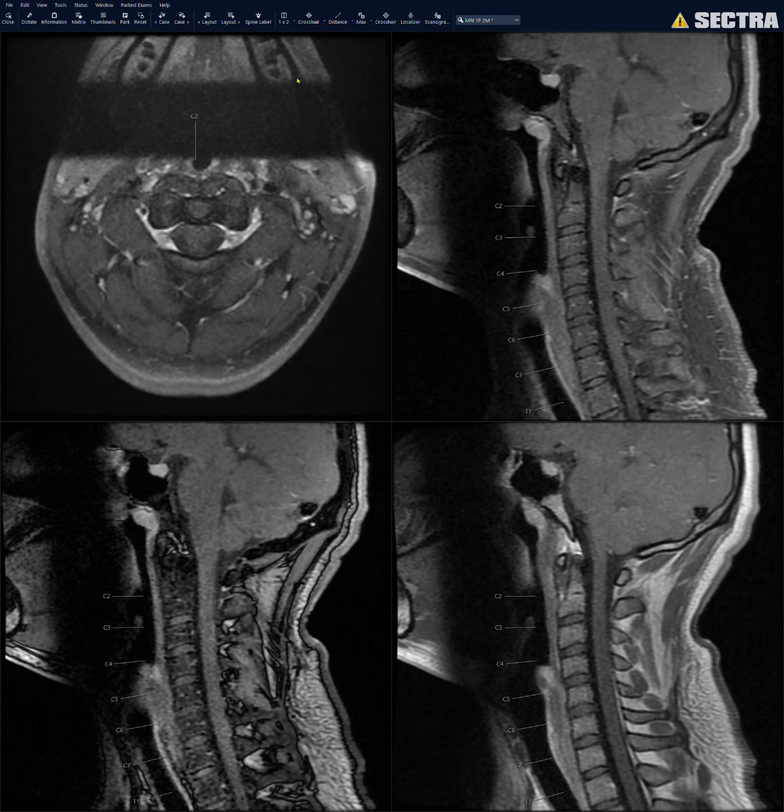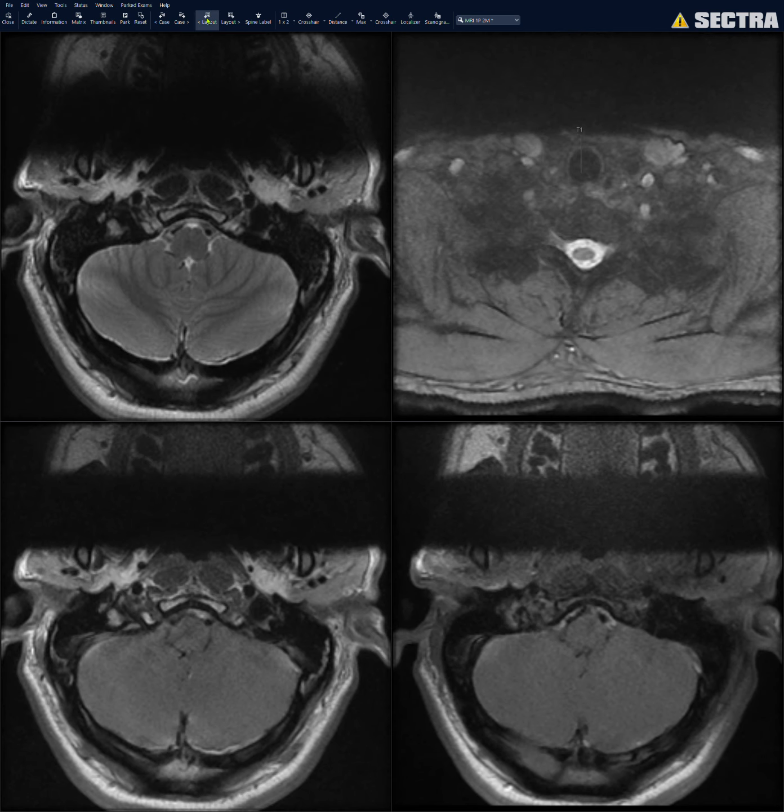And so if this is the setting of looking for a mass or looking at a trauma, sometimes this is where I would stop if the cervical spine looks otherwise normal. But if there's degenerative change or if they're looking for radiculopathy, then I go level by level. So let me show you what I mean by that.